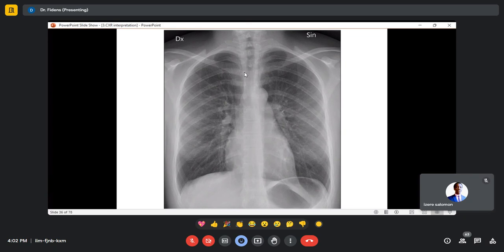What is this anatomically? These structures, this one? Who can answer the question? Transverse process. Check very well on your computer. I am talking about this, this small one. Remember, these are spinous processes. But how about this laterally? You can continue seeing them from up to downwards. This.